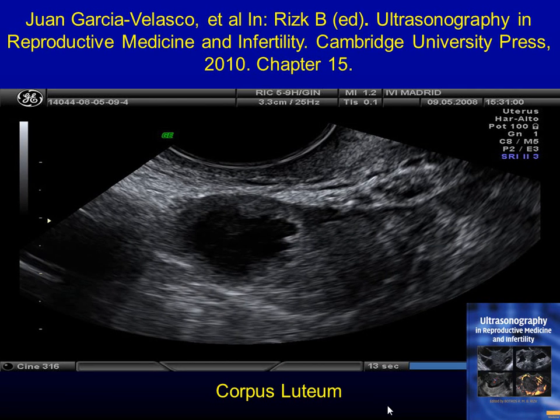Because I'll show you 4 or 5 everything in the gynecology spectrum, with very few exceptions, with luck. This area looks like pseudopapillae, but it's not cancer. This is just a hemorrhagic cyst. Hemorrhagic cyst means the collapsed area where the egg was 2 weeks ago. That's simply what it means. And the treatment for that is nothing.